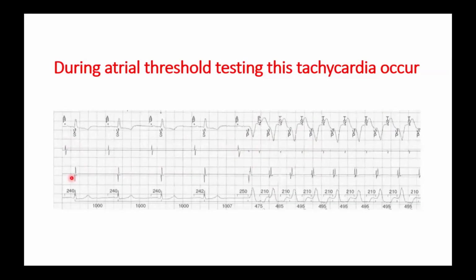Iman Saeed. I think, Dr. Mervat, when you pace the atrium and sense the atrium and the ventricle channel, the PMT will occur. So you should increase the PVARP, I think. Okay. Why did it occur here? What happened? What's wrong? Yeah, your answer is correct, but how can you explain it?